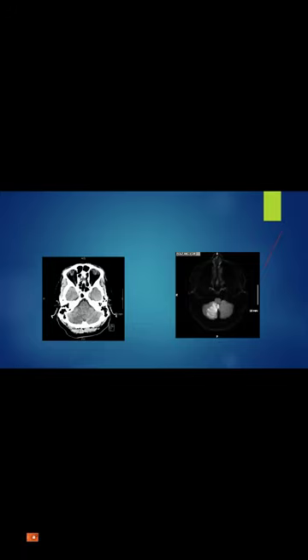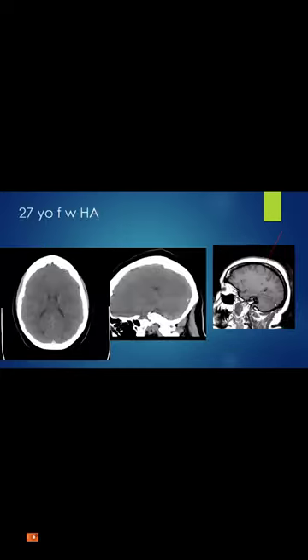So look carefully for hypodensities, specifically, because there is a tendency to ignore the cerebellum, basically because many CTs have limited evaluation of the posterior fossa structures because of streak artifacts from the dense bone of the petrous and the occipital bones.